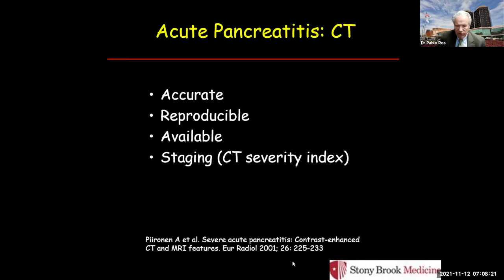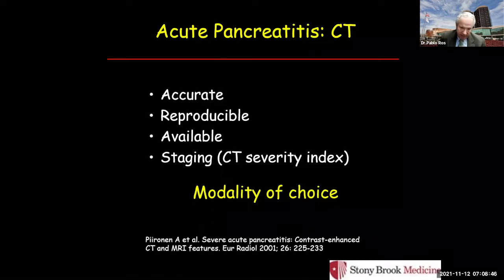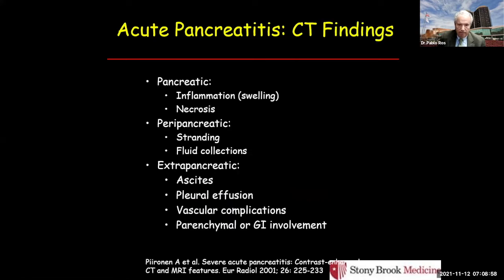Nothing has really changed in the last 20 years in the imaging of acute pancreatitis. The principles started at the beginning of CT in the 1980s, but since 2000 plus, with some variations, we have been on the right track for the diagnosis and staging of acute pancreatitis. Certainly, CT is the modality of choice. MR can be used, ultrasound can be used, particularly in less severe cases, but at the end of the day, CT in patients with serious, concerning acute pancreatitis is the way to go. CT findings, again, haven't really changed in 20 years.